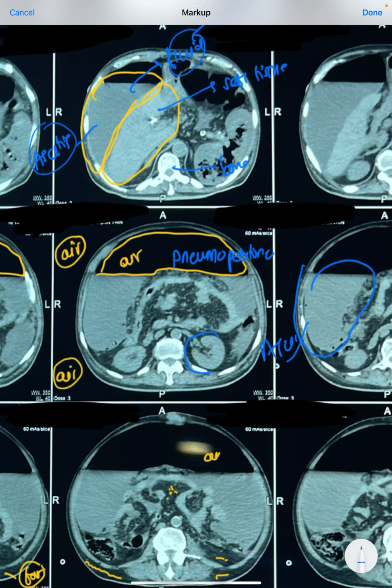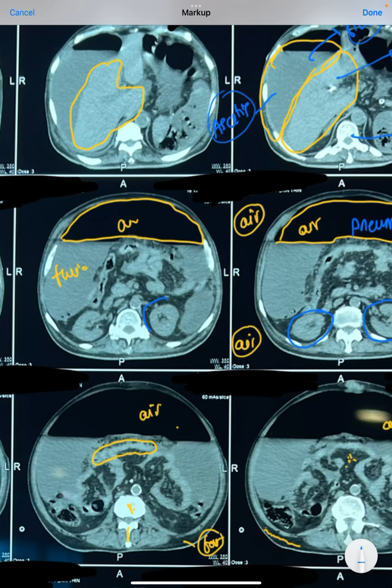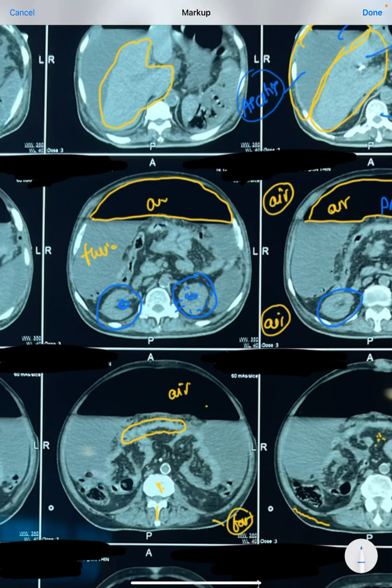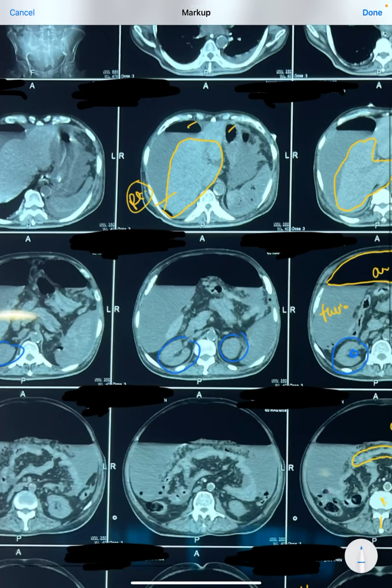These are the two kidneys. This is the left side kidney, this is the right side kidney, and these kidneys look okay. All the margins are crystal clear. There is not much infiltration or inflammation in the fat. There is no swelling in the pelvicalyceal system. There is no stone. So the kidneys are normal. So there is pretty good ascites. There is pneumoperitoneum. The liver appears okay.